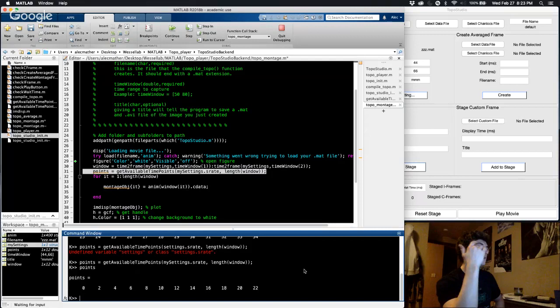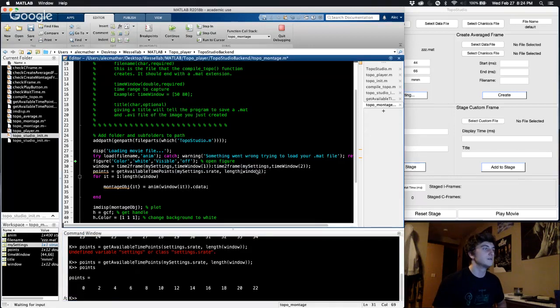I wanted the total number of frames, so I wanted the length of anim.